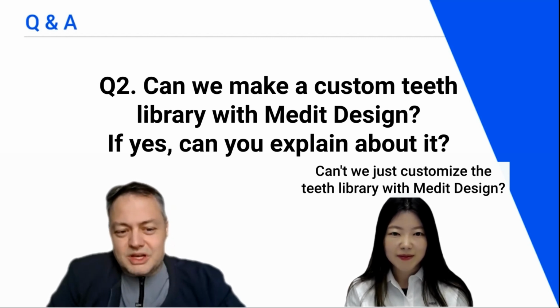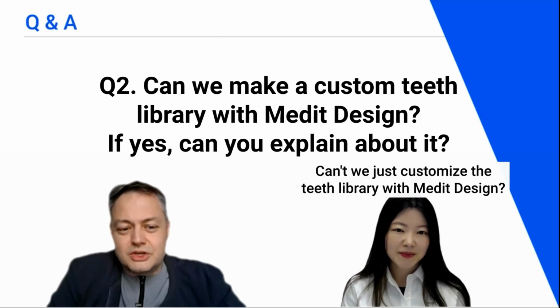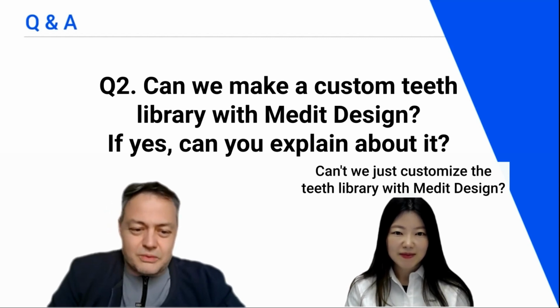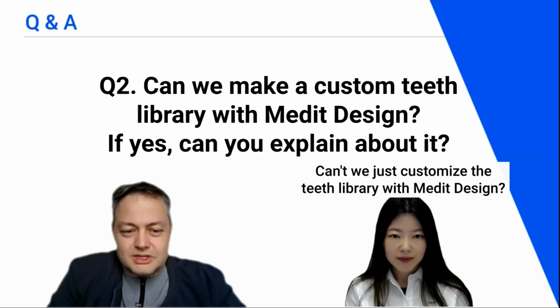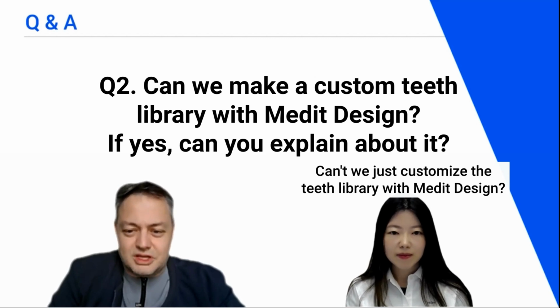So maybe it would be better to just use a library like this, like we've talked, to build the position of the teeth, to do all the cut intersections and place the connectors, and just then come to Medit Design and do your modifications there.